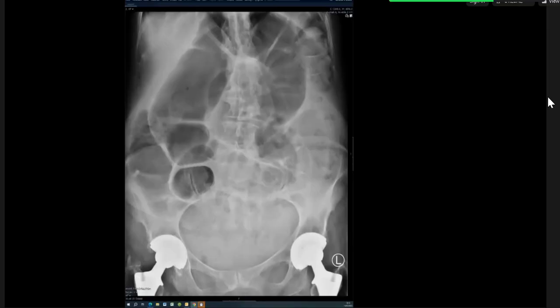So level of cecum. You think this dilated loop is cecum? Which one? This big one? No. Or this one? This one may be the right colon. Okay. So if the right colon is dilated, would the obstruction be distal to the right colon or proximal?